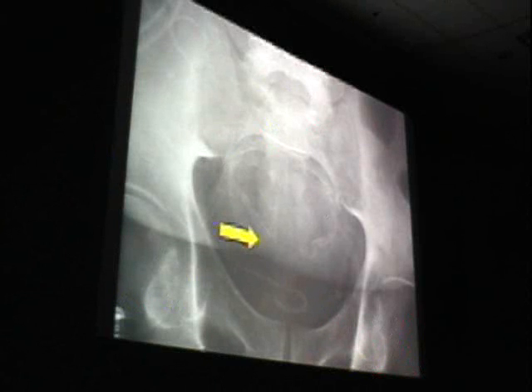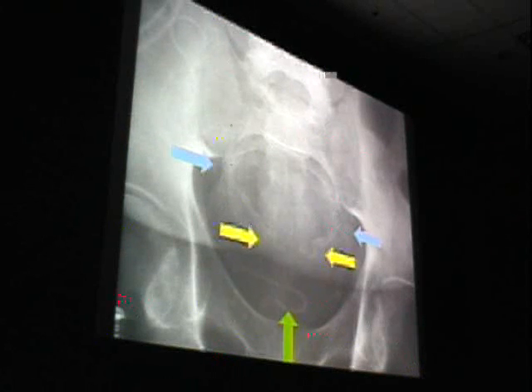What do we mean? Well, conduit wall, here we basically have three conduits, one man-made and two part of the patient. We see vas deferens calcification there, conduit wall. We see blood vessels there, and of course this patient has a double J stent implant. We know this patient, most likely in this country, has type 1 diabetes. If he was from a foreign country, he might have schistosomiasis or tuberculosis producing that vas deferens calcification. But when we see that, we can say this patient has diabetes type 1.